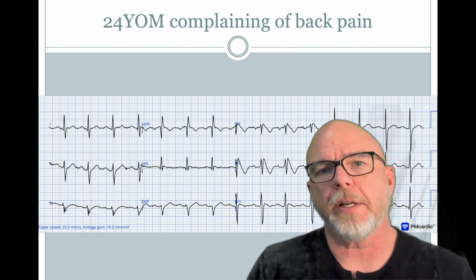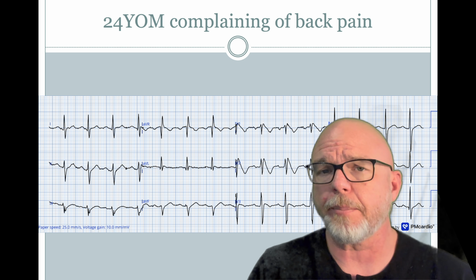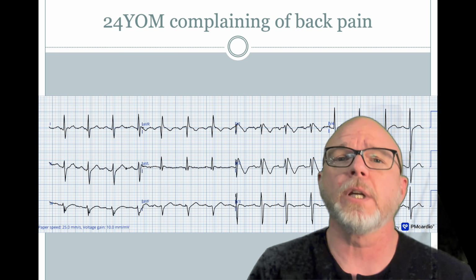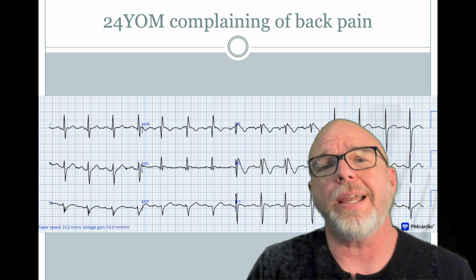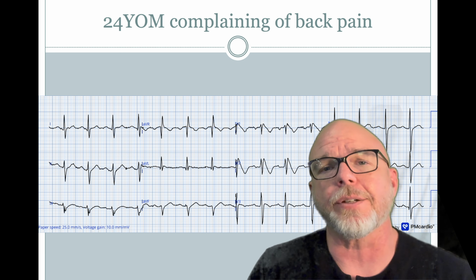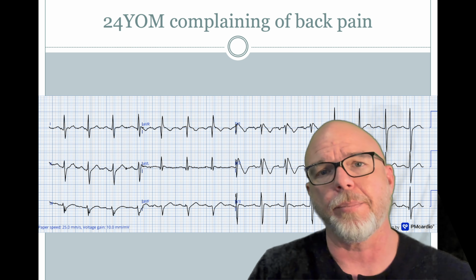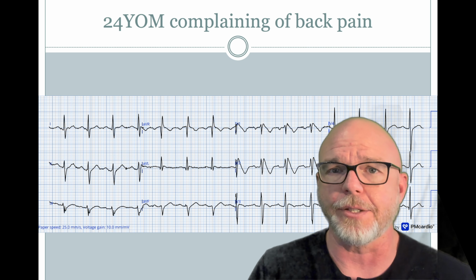This is a 24-year-old male complaining of back pain. And I have to admit, most 24-year-old males with back pain don't get an EKG from me, but the EMS crew on this call did a really fantastic job. Now, normally, if a patient on scene is complaining of back pain, that means there's 3 people on scene. There's a paramedic crew plus the patient complaining of back pain, and any one of them might have the worst one. It's not necessarily the patient.